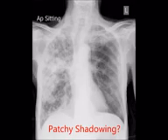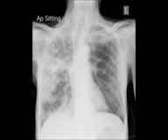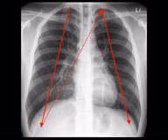For example, you could describe what you see here as patchy shadowing, widespread areas of increased density, multifocal opacification, or you might even get away with a load of white fuzz that probably shouldn't be here. Look carefully from the top at the apices to the bottom where the lung extends just below where you can see the diaphragm. Compare left to right.